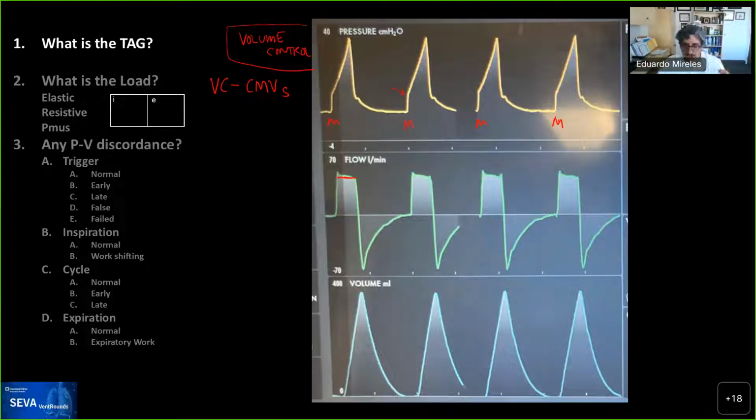Then because you're controlling all of these things, you're setting the points, or this is set point targeting, and so you control everything. Rob? Just to say that all ventilators have very different and unique looking operator interfaces. They have different colors for the waveforms. They show where the patient trigger on pressure or flow in different ways, and you will get to recognize that. We have basically like four major platforms at the Cleveland Clinic, and a bunch of other ones that have to do with home care ventilators and things like that. But all this stuff will become like looking at a roadmap.